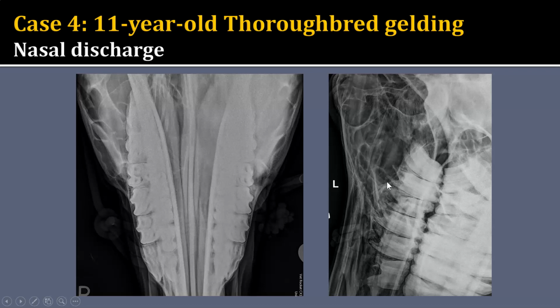When we look at the periapical region, there's increased bone opacity. There's also a very small amount of fluid with a fluid line in that rostral compartment of the maxillary sinus. So increased soft tissue fluid opacity as well as sclerosis. And then surrounding the roots of this tooth is some periapical lucency, some widening of the periodontal space. And then if you look at these roots, they have an abnormal shape compared to the other teeth, so they seem to be blunted and malformed.